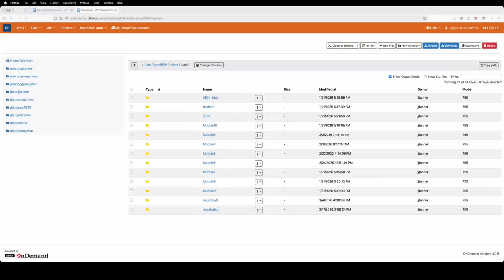I will walk you through a voxel-based morphometry (VBM) analysis. This is going to use SPM12 and CAT12. We have previously used CAT12 in a previous module, and so this will just build on that. And this will allow us to compare two groups of individuals, look at their brains to see if they have different amounts of gray matter in parts of their brains.